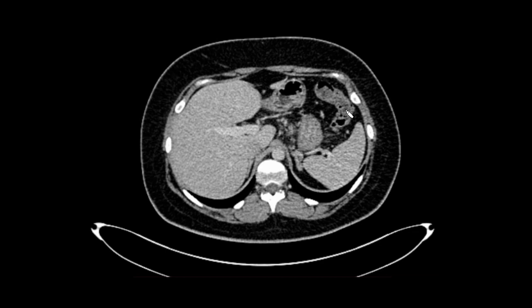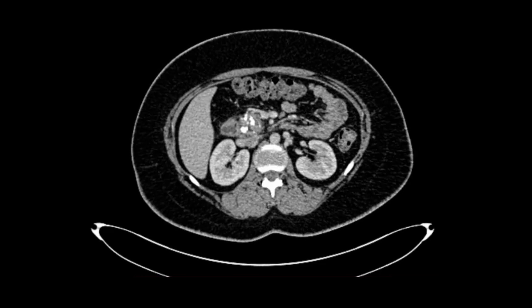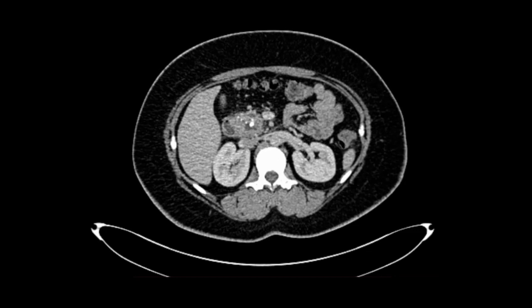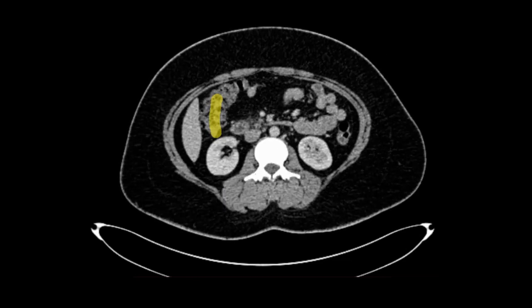I'll again say it's the fecal sign, mixture of air which is black and fecal content which is different shades of grey is what identifies the colon, right? Here you can compare the fecal, right, air and the grey matter, and that is not present in these loops. These are the jejunal loops, right? If fecal sign is present in the jejunal loops, it's a sign of long-standing intestinal obstruction, right? So coming back to the hepatic flexure, this is the hepatic flexure.